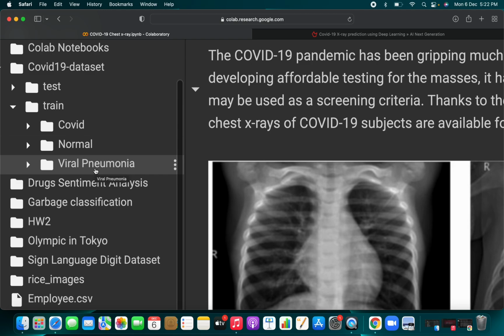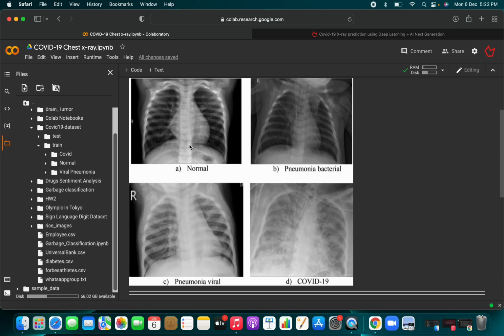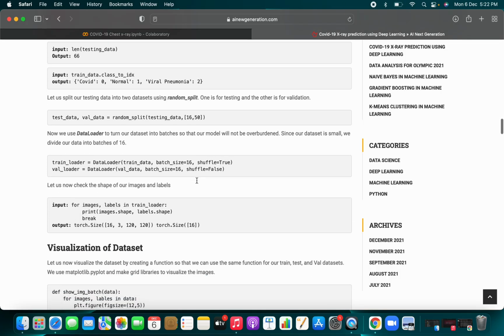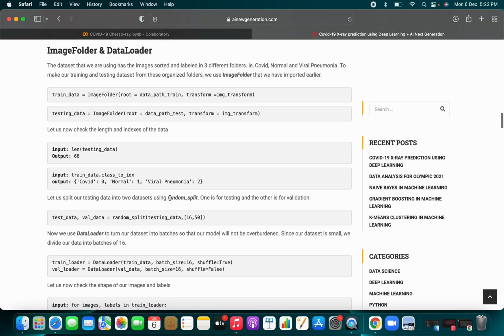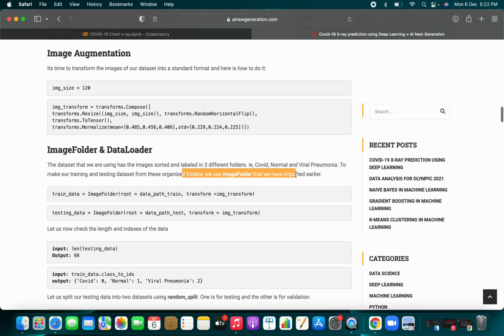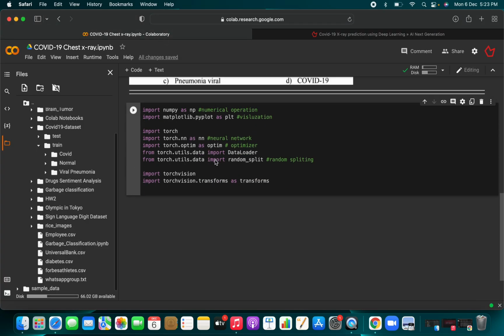So basically with ImageFolder, all the images inside that folder are the features, and the target or label is, for example, COVID. Okay, so it's clear to you. ImageFolder is really easy. Pranavi has also explained about ImageFolder, so you can directly go and read about it. It is written there, it's really easy, you don't have to go in depth. So I think it's clear to you.